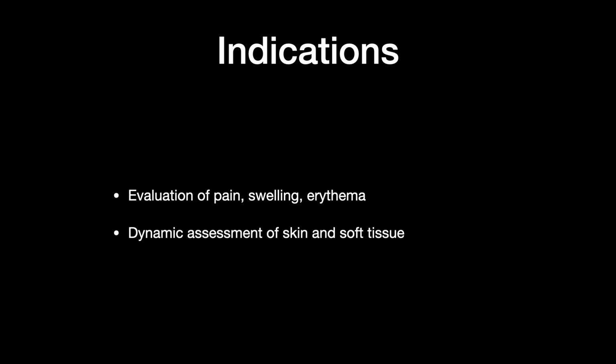So with that said, let's talk a little bit about anatomy. We'll talk about the layers of the skin that we see, and then apply the ultrasound to that and see that we can really identify those different layers on the ultrasound and help us figure out where these lesions are.